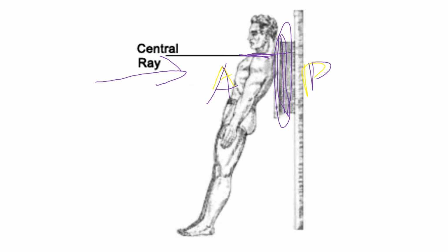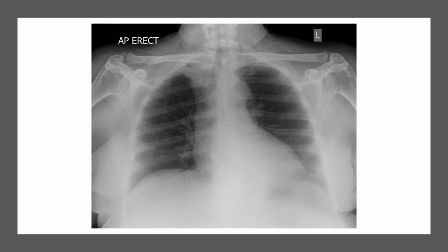So the apical lordotic picture will give you that good picture of the apices without the clavicles getting in the way. Because remember, the apices of the lungs go above the clavicles, right? They curve up higher than the clavicles, so that gets them out of the way. Well, why the apices? Why would these things show up in the apices? Some of the things that can show up are nodules like TB granulomas from tuberculosis, and other things like lung cancer nodules. If it's a non-small cell carcinoma, that would show up in the apices. It's more common in the right upper lobe, and so that's some of the things that you'll be looking at as well. So this is an apical lordotic, right? You see how high the clavicle is up here. So that's going to be one of the things that you'll look at here.